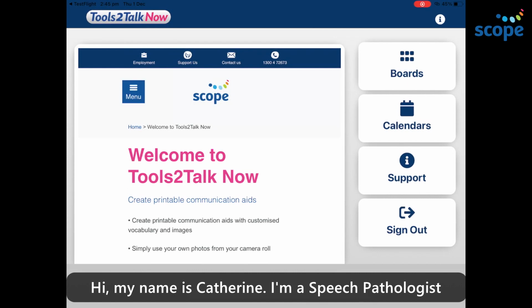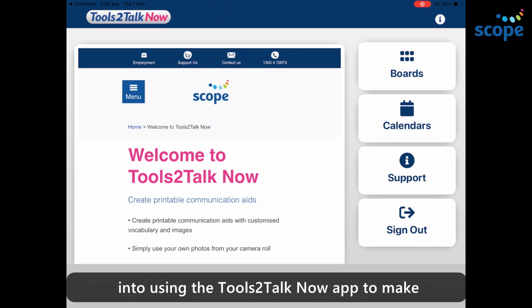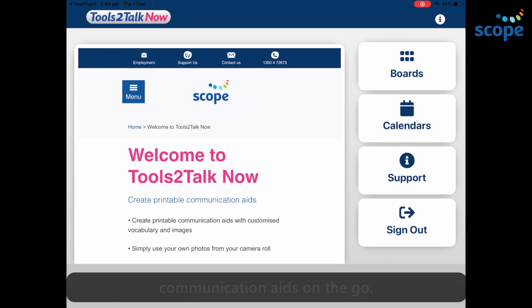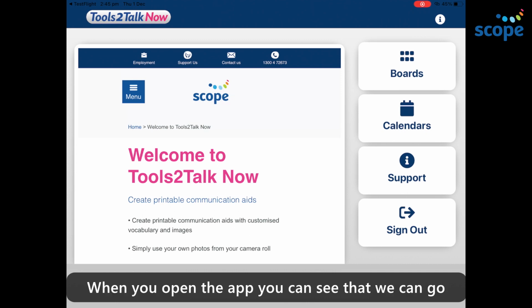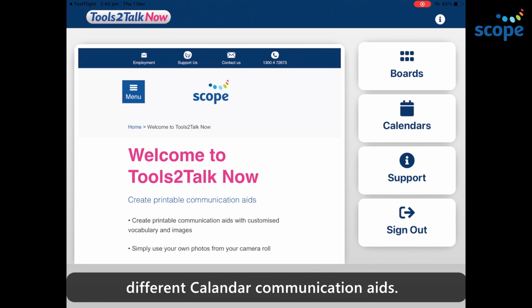I'm a speech pathologist at Scope, and I'm going to give you an introduction into using the Tools2Talk Now app to make communication aids on the go. When you open the app, you can see that we can go into boards to make customized communication aids, or we can go into calendars to make a range of different calendar communication aids.